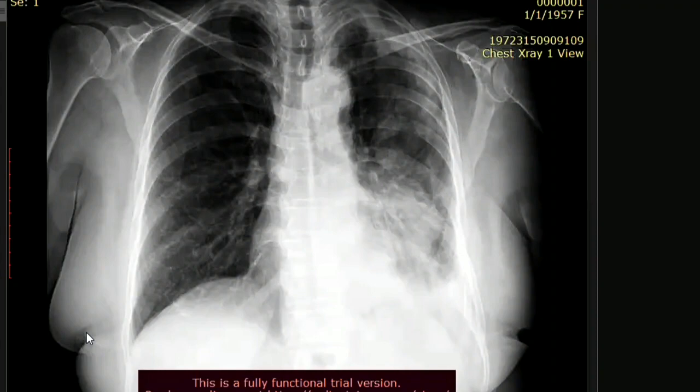It can be tubercular involvement of the pleura, or it can be metastatic disease. It can be a mesothelioma, and it also has a pleural effusion. So I would definitely go for further evaluation and CT scan. So there is some mass hidden in the left lower zone also.